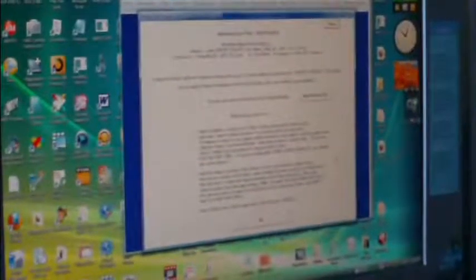When we click on OK, we get an actual dialog box in which we make the choice as to whether we want the data set currently at the folder to be designated the current one, or the data set currently in this computer to be designated the current one. Or in case you can't handle this choice at this time and you just want to think it over and try again later, then click on I want to think it over and cancel out, and then you can come back and try the same thing again.